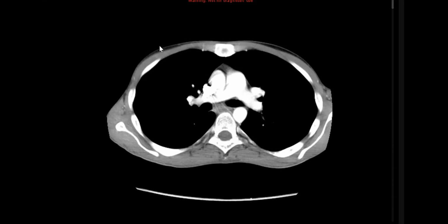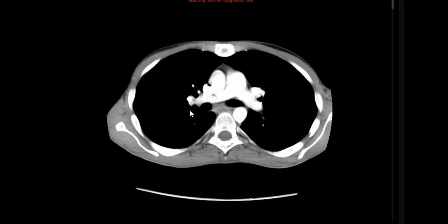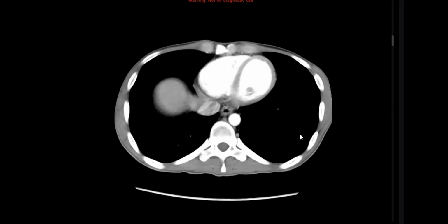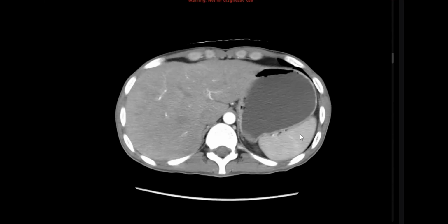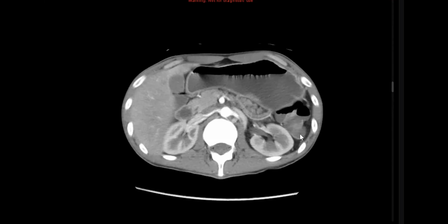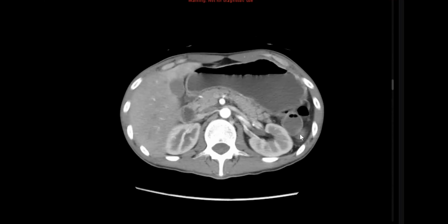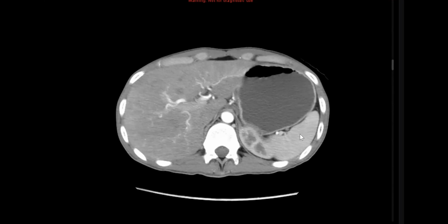And I want a classic approach. Acute abdomen, 25 years old. I'm presented with a CT abdomen with contrast in the arterial phase. Just scan through the study. I cannot see any abnormality in the liver.